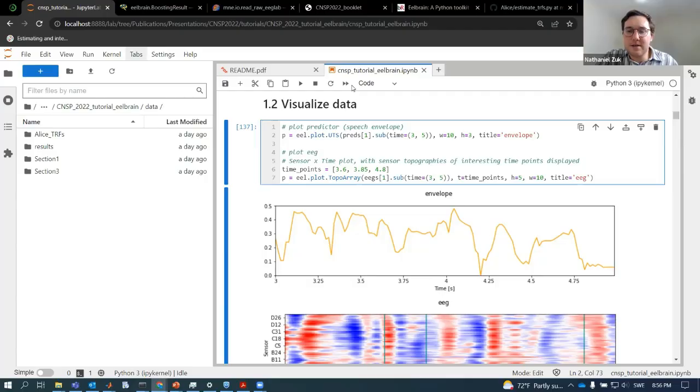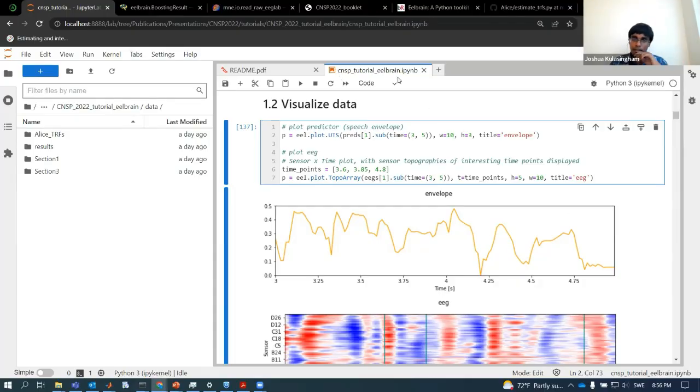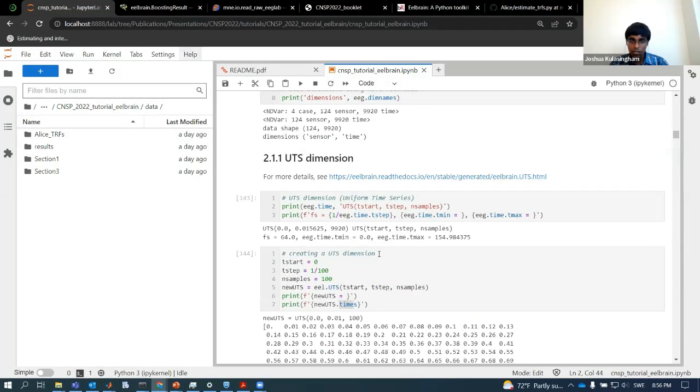I guess, what does the interactive version add? Sure. It's basically the interactive plot. You have all the components, and you can select components in a GUI, and also look at the time course of the component and the frequency spectrum of that component, and just click to reject components. So it's just easy. But I think it's not worth going into it because I need to load all the ICA and the data and all of that. It's going to take a bit more time, and we're already almost at time.